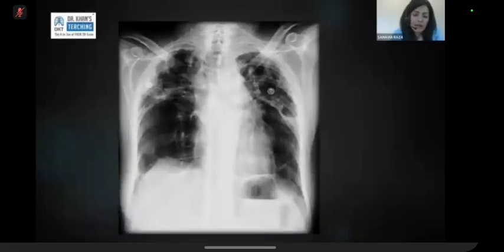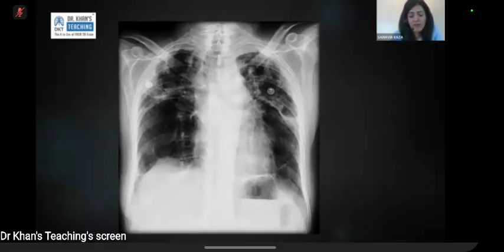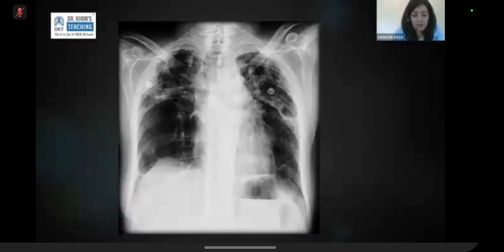When it's stage 4, then the diagnosis isn't that easy to make, because you have a lot of other diseases that can give you upper to mid zone fibrosis, and sarcoidosis happens to be one of them. On a chest x-ray especially, the appearances are very non-specific. So they can be asymmetrical, or symmetrical, which is more common. Upper to mid zone fibrotic changes, and then the differential has sarcoidosis in it.